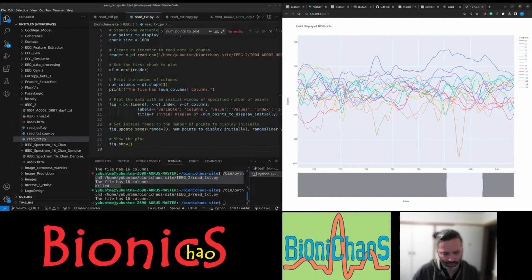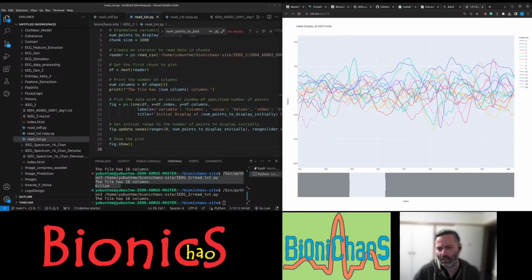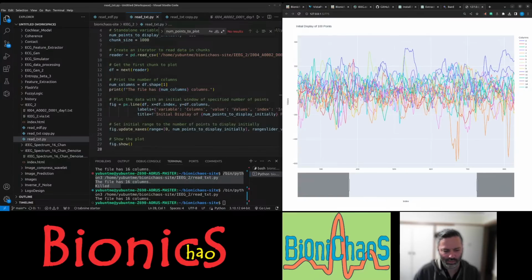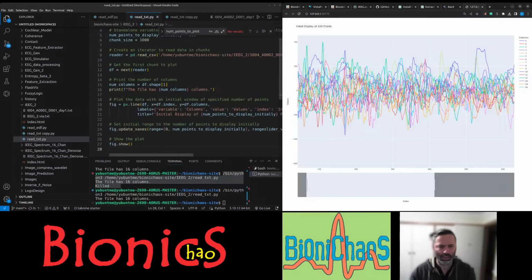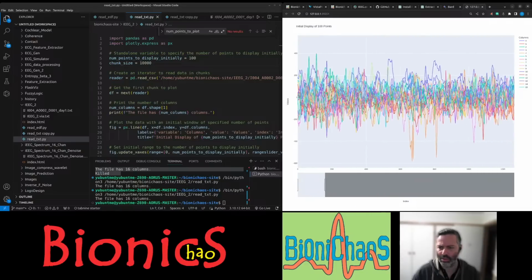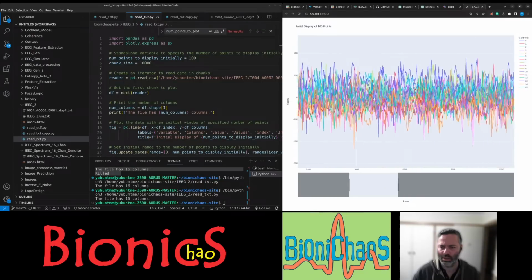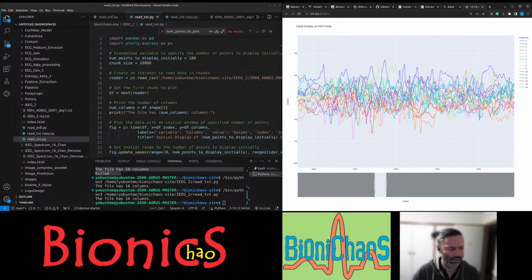We also need to automate the fact that once you get to the end here, it will load more data. Also this data, we also need to make sure we're plotting the right thing. But 10,000, can we handle? 10,000. Yeah, we need to make sure.